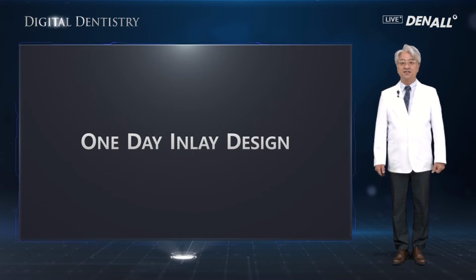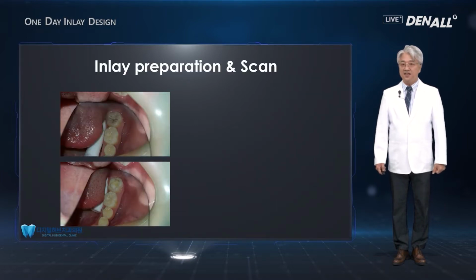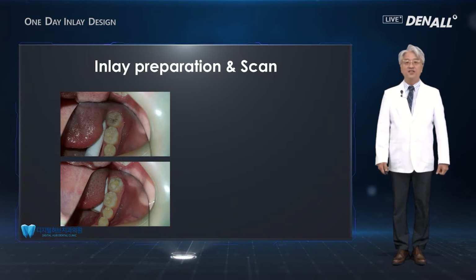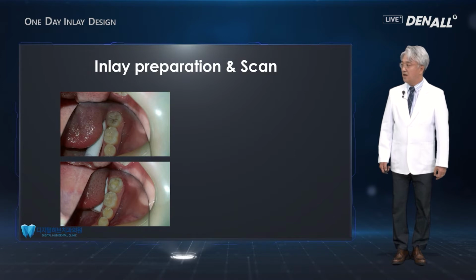Today, we are going to look at part 8 of this lecture series on the one-day inlay design. First, when it comes to inlay, this is a case that I did with the one-day inlay.